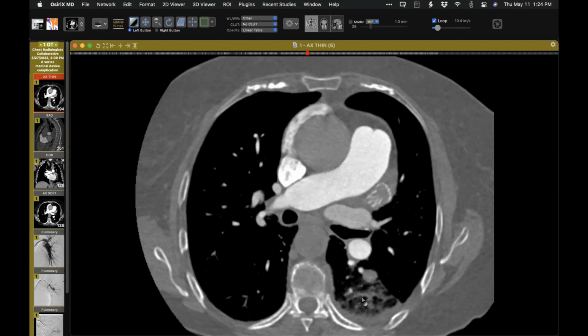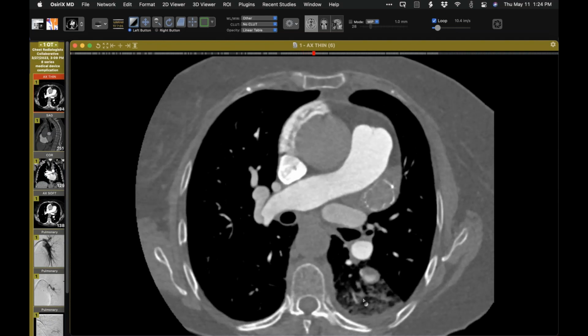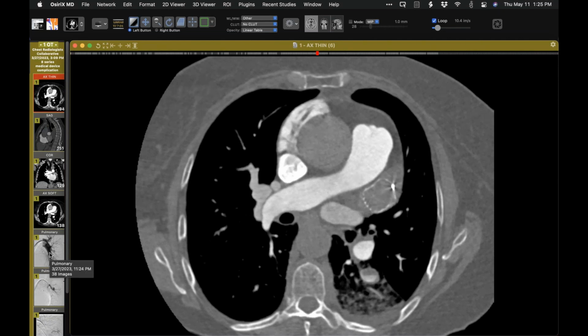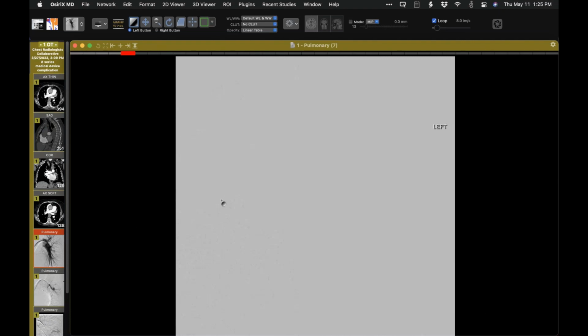So we had to get some history to find out whether at the outside hospital they had recently done some kind of intervention, which it turns out they had, which was a right heart cath. So we surmise that this is iatrogenic pseudoaneurysm or aneurysm from that procedure. And no surprise, patient went to IR.